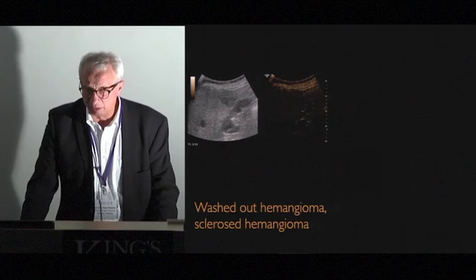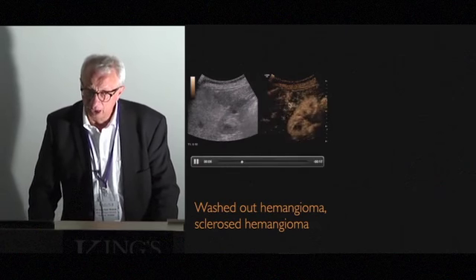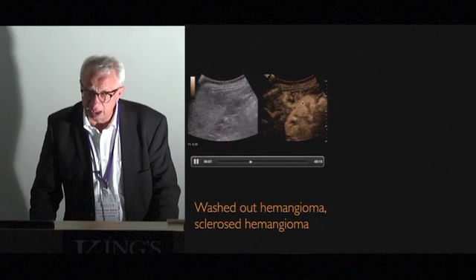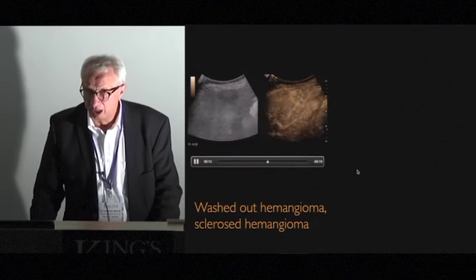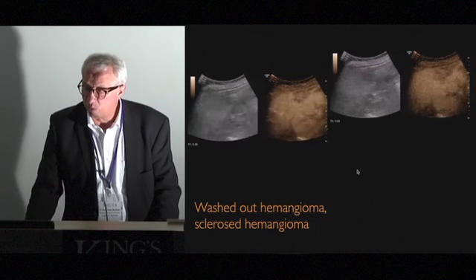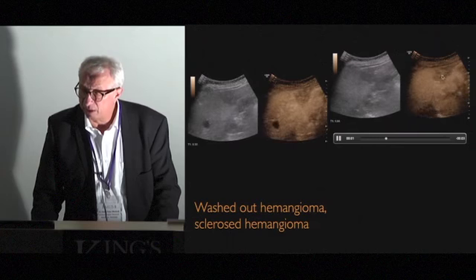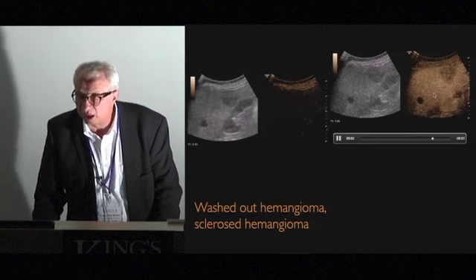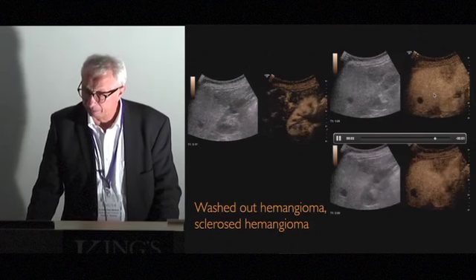So this is the arterial phase. You can see that the contrast is arriving. So here is the enhancement, and it's dominantly in the periphery. It's enhancing. But also in the center, you can see some enhancement. So we wait, and this is after 1 minute, and then you can see the periphery looks like it's washing out, and the center is taking up contrast.